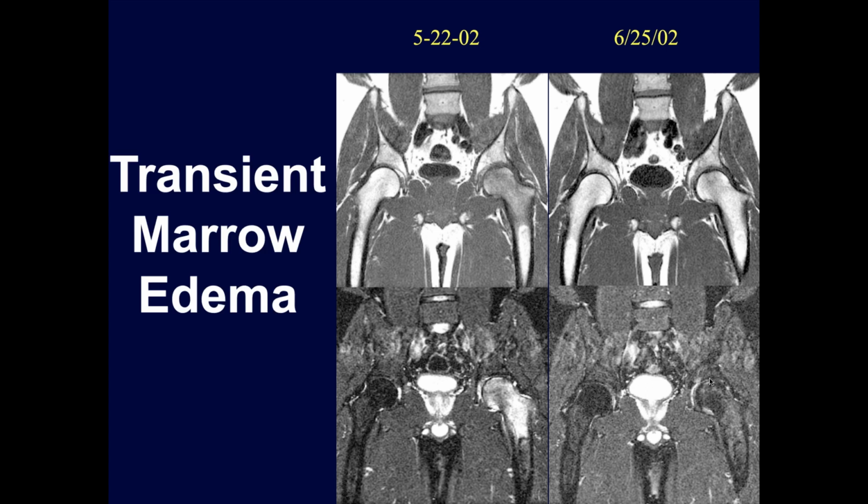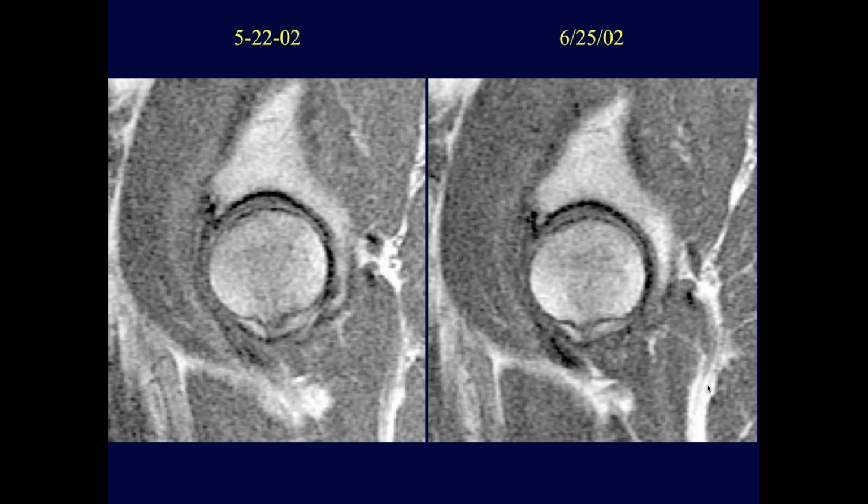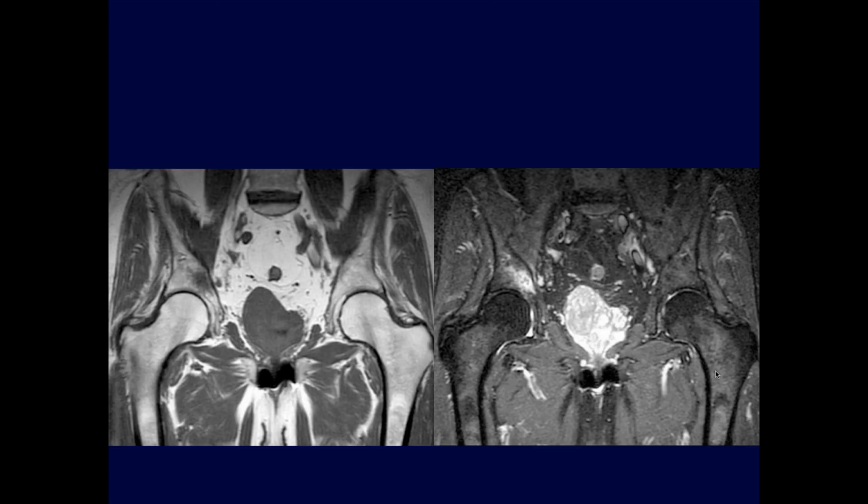Yeah, so this is classic transient bone marrow edema, but you can see there's a little bit of a subchondral impaction, very subtle there. These patients like that physician's assistant I showed yesterday tend to have a pretty good prognosis. These are just the sagittal images, T1s. Okay. If you leave them alone. Right, if you leave them alone, right. If you let them heal.